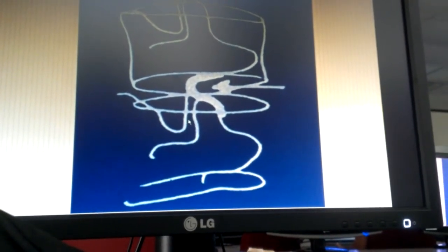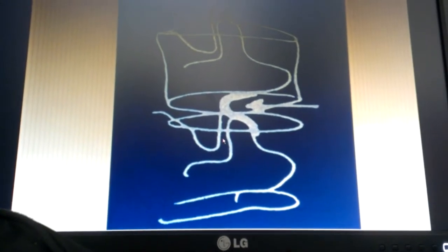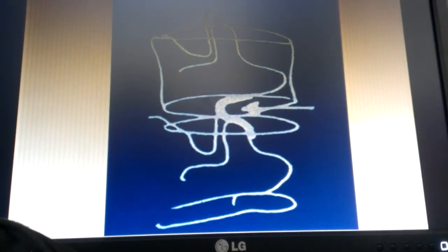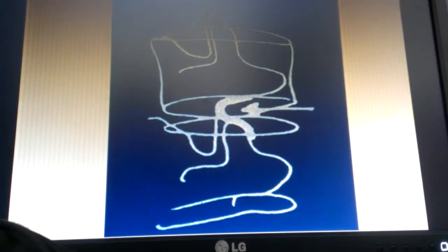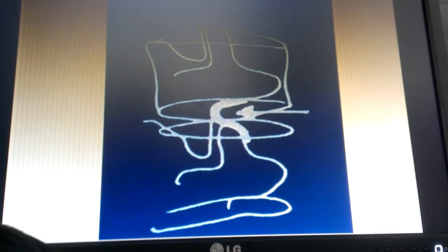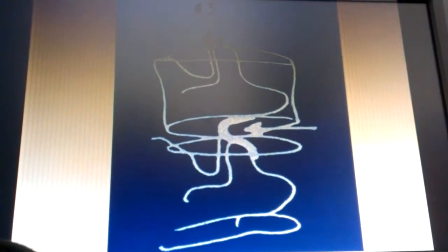We don't get enough gapping of our articulations in most instances where we get out our rulers and measure, because they're just small measures. In some cases, if you've got something like degenerative anterolisthesis, then you can get what's called the W sign, where the articulations have been eroded, then you can see those substantially. Right?